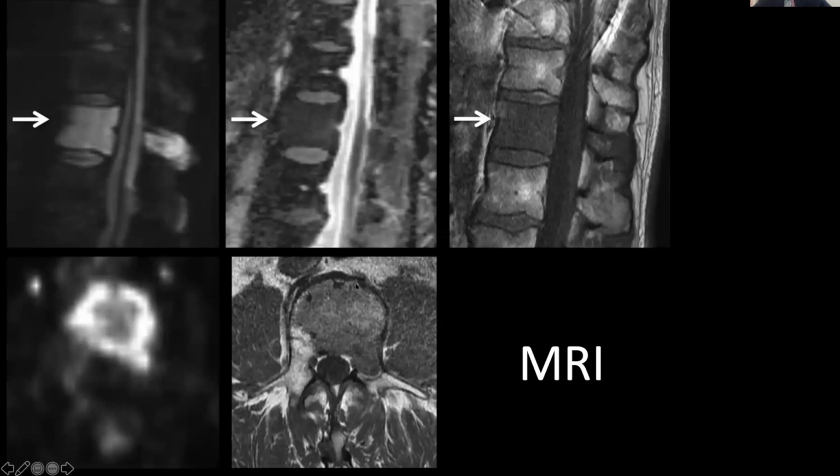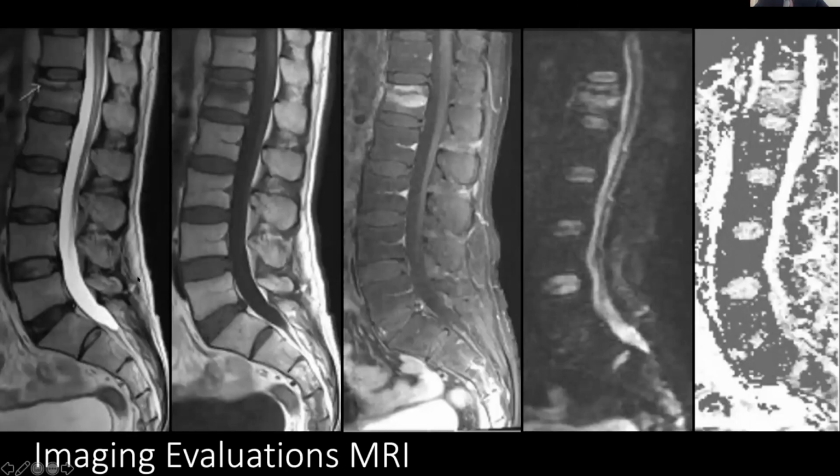Just kind of pulling that together. So again, you have your T1 sequence, where you can see that there's some sort of infiltration or some sort of abnormality of the marrow here. We have a STIR sequence, which is a type of T2 sequence, with bright signals showing where the abnormality is and which components of the bone are involved. And then we actually use the diffusion restriction here, which is quite useful for delineating or differentiating.